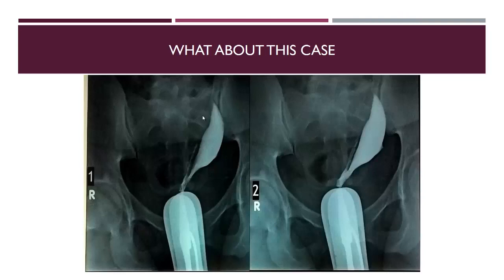Again, this is a large uterine cavity and it is pushed to the left side. But here, when we push the uterus, we found that there are two openings of the fallopian tubes. This is one and this is another one. So this is a misplaced uterus, but it is enlarged, and it may be due to a fibroid also.